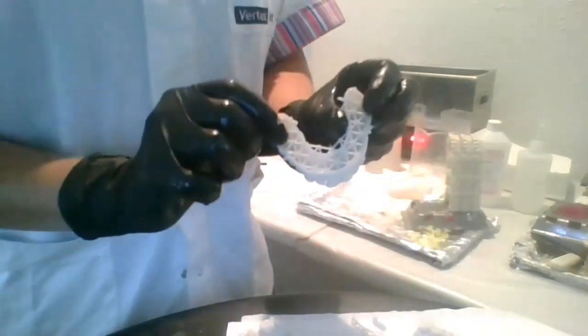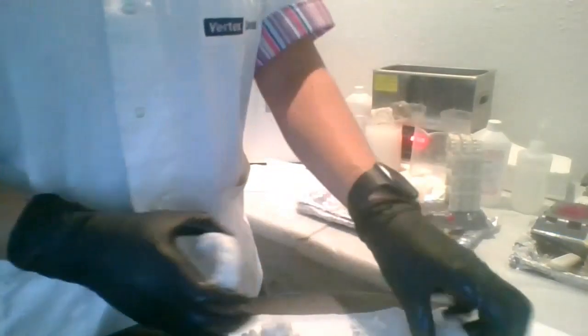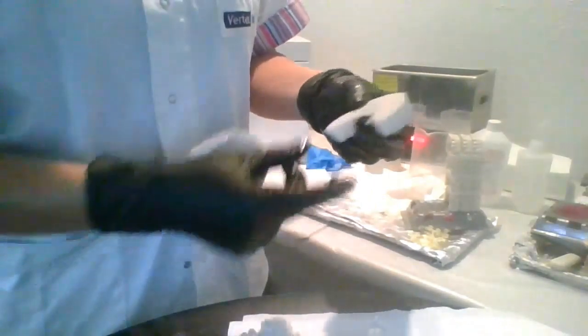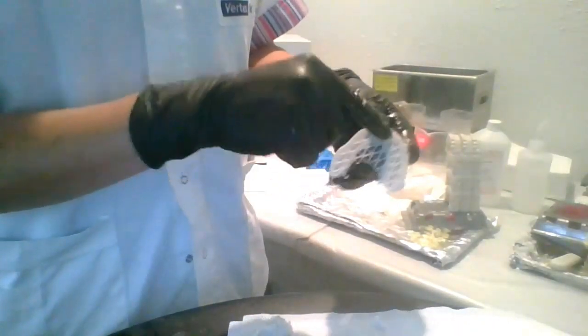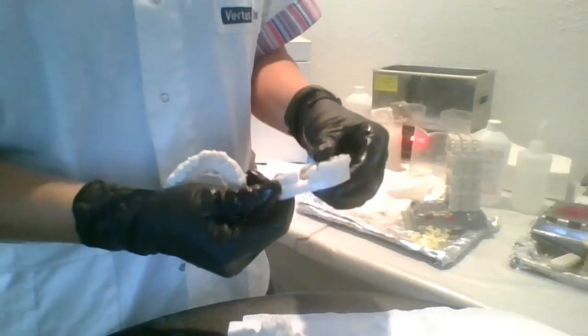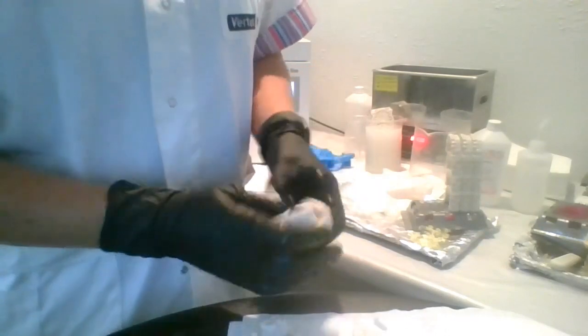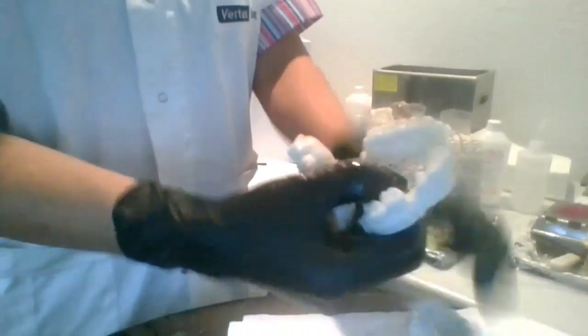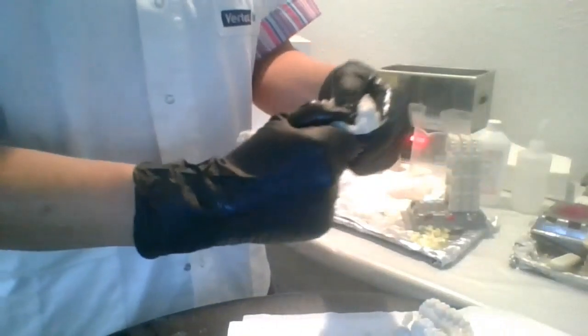No need to take off the underside of the lattice at all. I like to leave that lattice. It's nice looking. It doesn't affect anything during my thermoforming process. And you definitely want to leave that in there because that will add stability during that process. You can thermoform multiple times. So this is a real nice stable way to go ahead and do that. And if you want to pop off those feet, we've got everything perforated for you, okay?